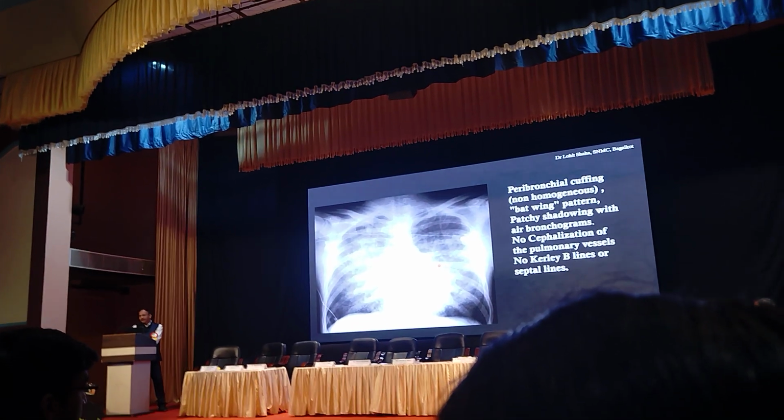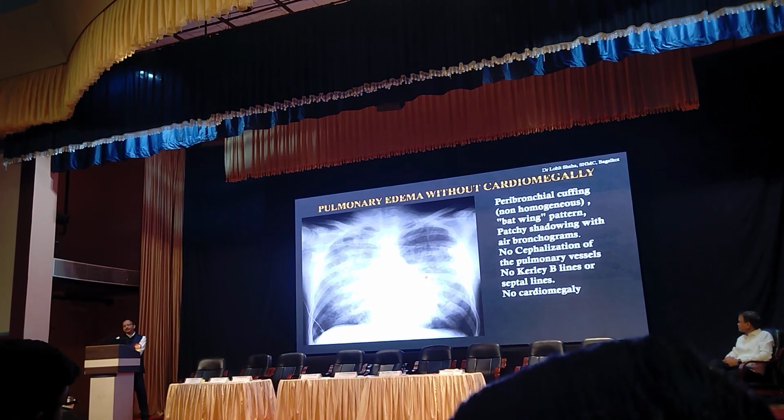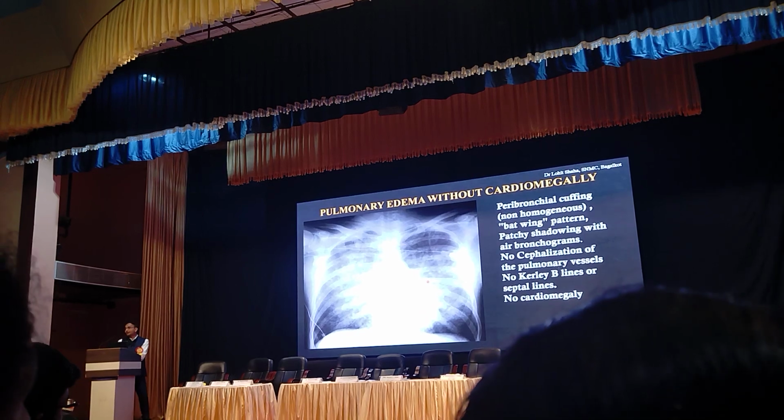And what about cardiomegaly, can you comment? Is it there? No. Very good. So that is pulmonary edema without cardiomegaly.